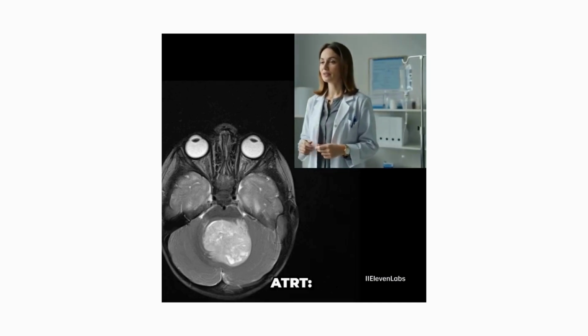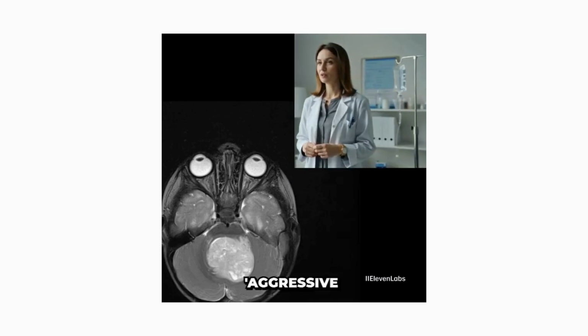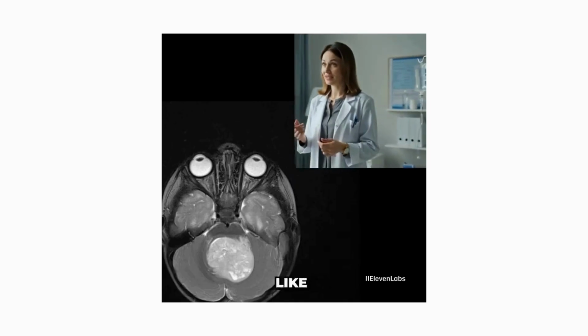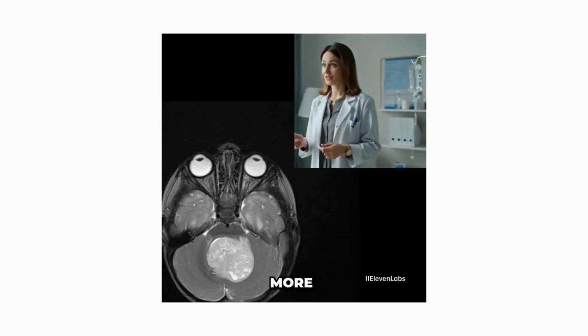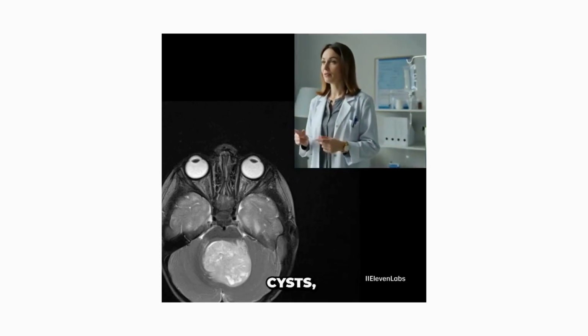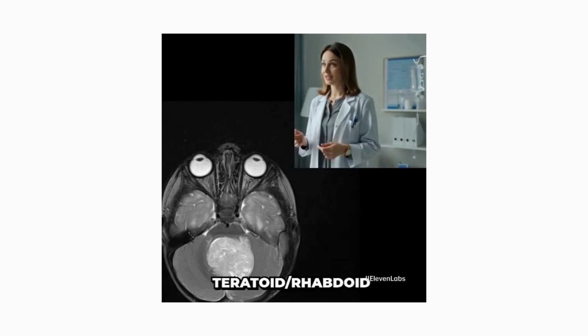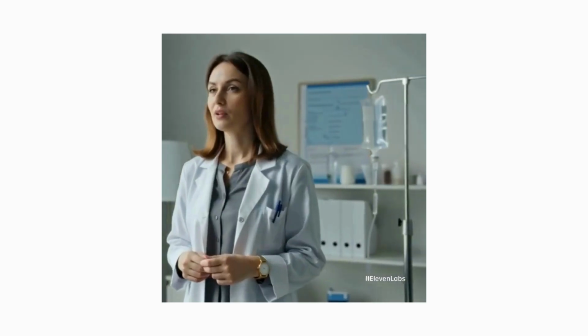ATRT. This is the aggressive cousin. If the patient is very young, usually under 3 years old, and the tumor looks like a medulloblastoma but is even more heterogeneous with eccentric cysts, you must consider atypical teratoid/rhabdoid tumor. Here are your clinical pearls for the report.